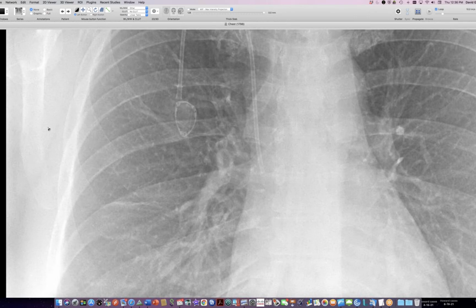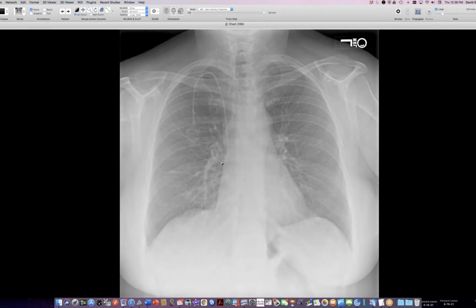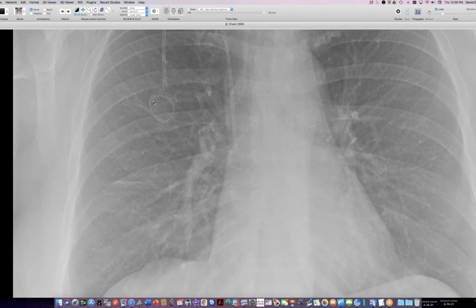Okay, and so here they are. This catheter is slightly tilted, and here is the same catheter now at a different time, and you can see that the CT is now a mirror image. So you read CT from right to left rather than left to right, and it's that way all the way around here. It's not just a question of this thing being upside down, but this port is actually flipped in the pocket, and the back part of the port is out, which is a hard surface that cannot be injected.